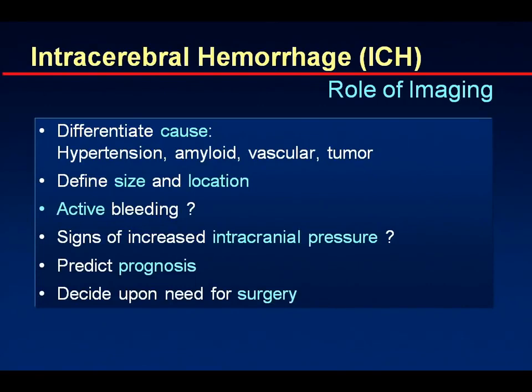There is not yet systematic treatment, but maybe at one point there might be something for interventional radiologists to do there. But at the moment, that's not done. Then, of course, signs of increasing intracranial pressure, which will give you an indication for surgery. And prognosis I already mentioned.